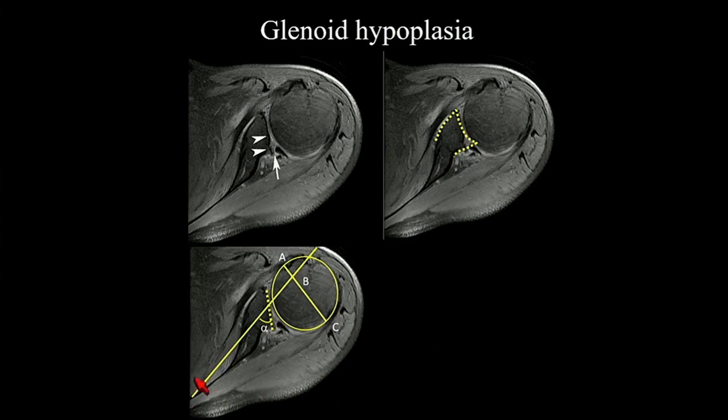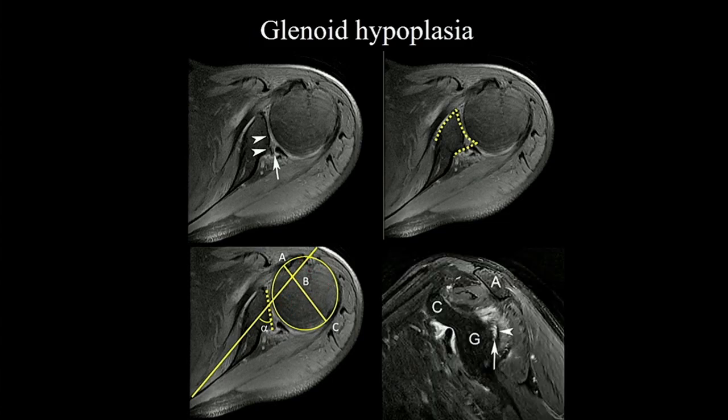Normally, this is about the outline of what you would expect to see, and this should be relatively flush to an angle along the long axis of the scapular blade. If you extend a line along the scapular angle, notice how posteriorly this is angled. It's not 90 degrees at all. And look where the axis is going through the humeral head. There is posterior displacement of that humeral head because it is unstable. In addition, we've got a problem with the posterior labrum. It's torn, and we also see some paralabral cysts.